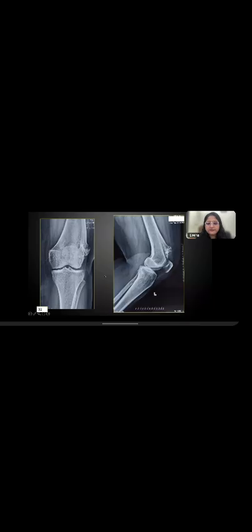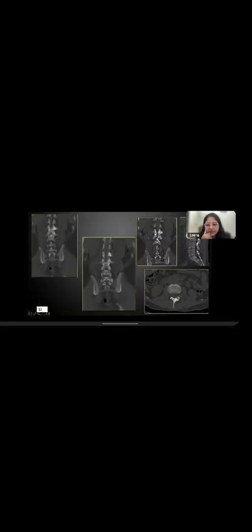32. Again, a very typical benign lesion. Osteochondroma. Ganesh says osteochondroma, very good. I would request, if it is possible, to write the case number, because now we are going a little faster. Okay, case number 33. What do you see?